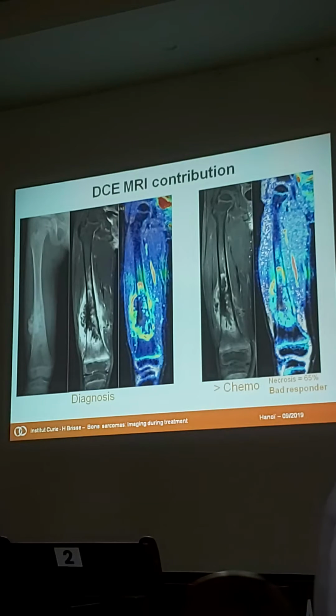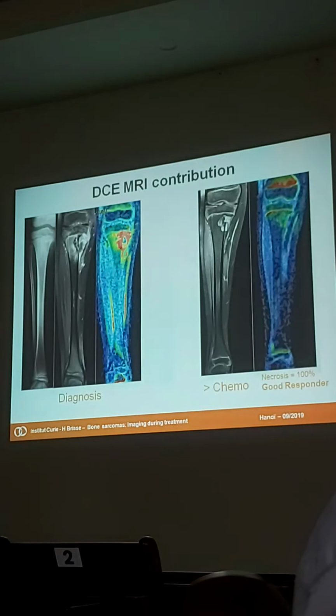Yeah. Okay, so what you have to remember is that the red spot here means a very rapid enhancement, and the blue spot is a slow growing enhancement. So if you make a late image, like 5 minutes after injection, you have the same signal, but the shape of the curve of enhancement is completely different. So this helps to make the differentiation between the different tissues.